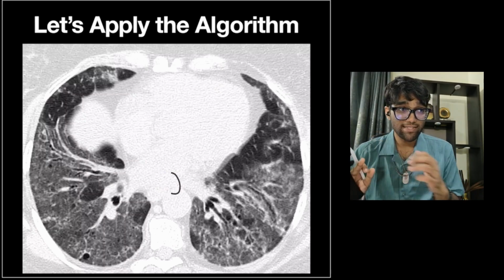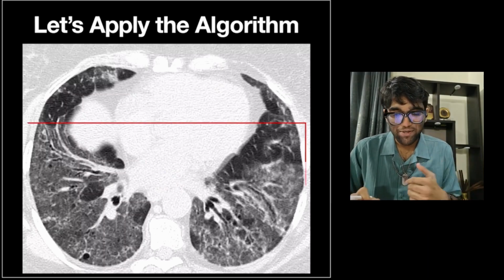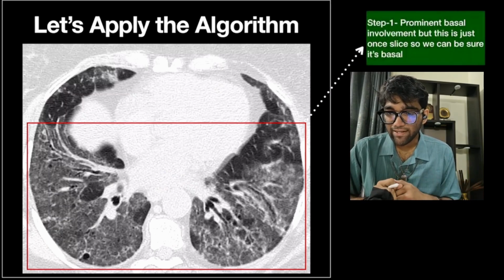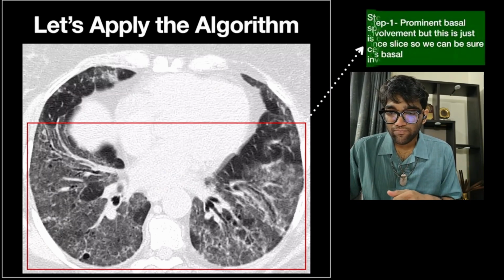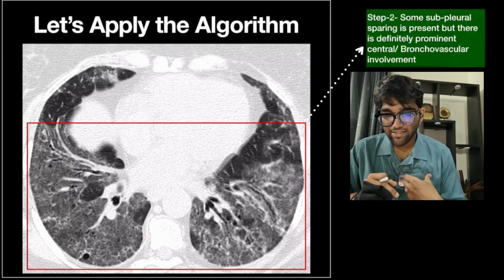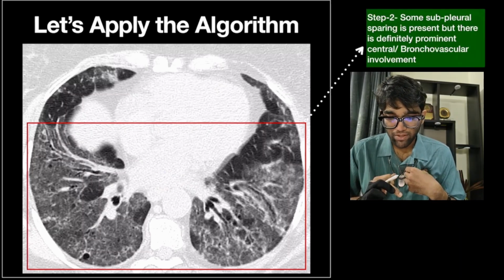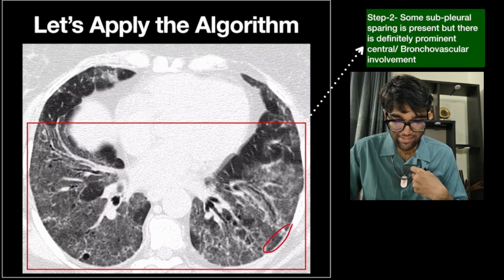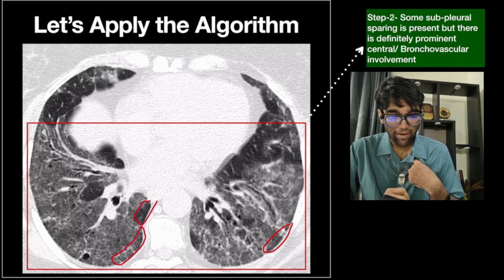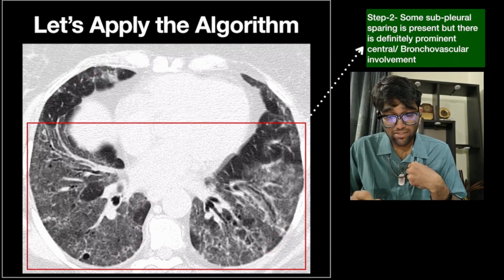So step 1, there is definitely a basal predominance, although I have not shown you the apical images, but take my word for it for now, because I wanted the images to be very clear. So we'll just go to step 2. In step 2, what we find is that there are some areas where there is subpleural sparing. Now it's very subtle, that's why I wanted the image to be very large. There is subpleural sparing in some areas, here as well. Now subpleural sparing means it's not UIP.